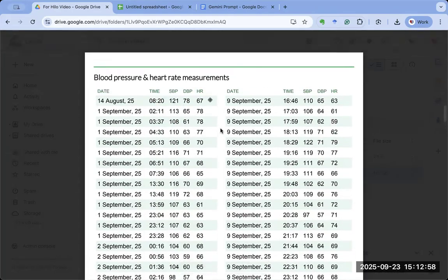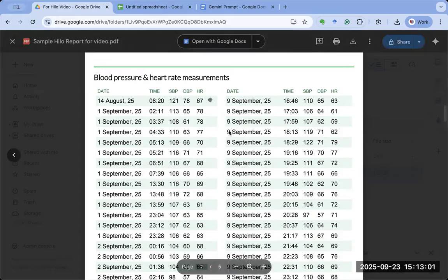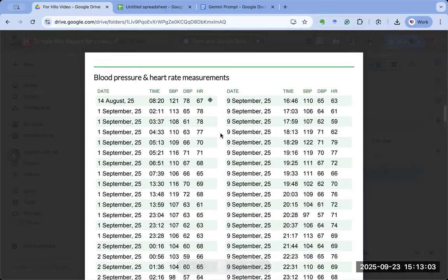Next, I am going to analyze this data. In the ideal case, I'm sure in the future we're going to have something where we put the data into an app or a web or browser-based tool, and it's going to come out with all the analysis for us. At this point in time, I don't have access to anything like that, and I will not create one without having the security and privacy measures in place.